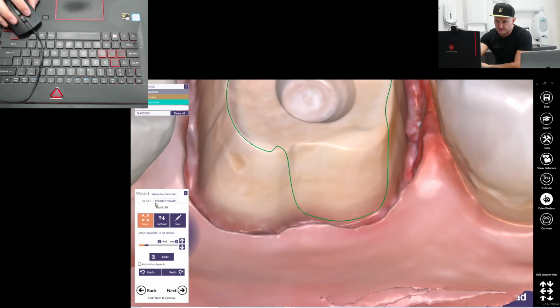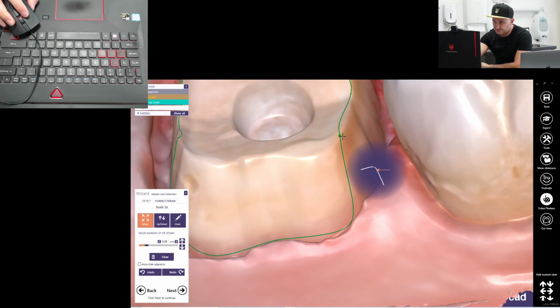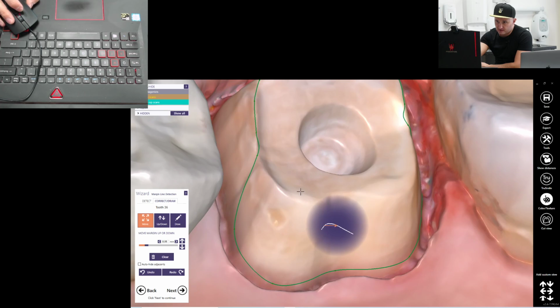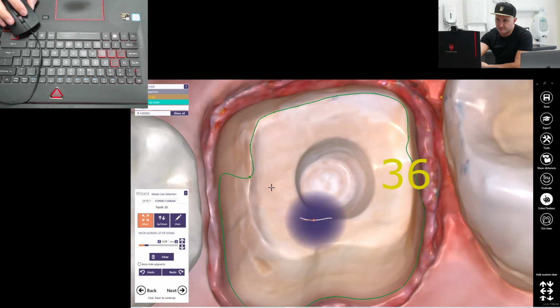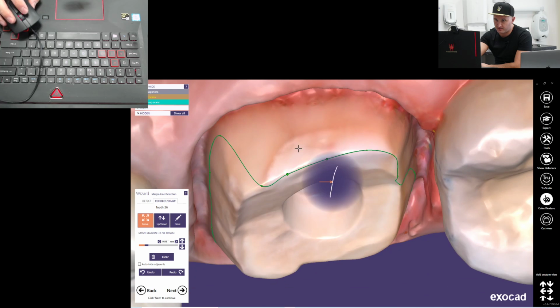So you just choose the option correct draw, and you move the points as you wish your margin line should look, pretty easily. In fact, it's easy if you have good quality of your scan data. If not, it will not be so easy.